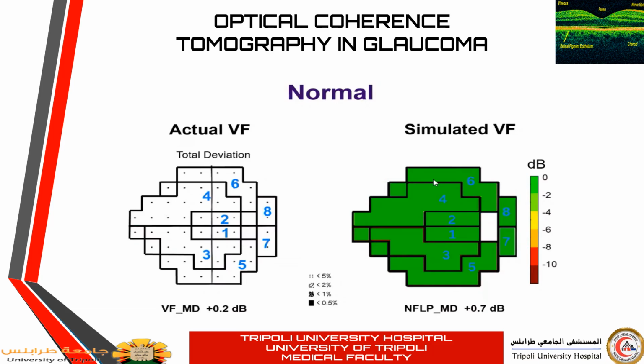any deviation from the statistically normal population, and if there is any statistically significant deviation from the norm. And the green color, as you know, usually represents within the normal distribution curve, that is, between 5 to 95% of the normal population.